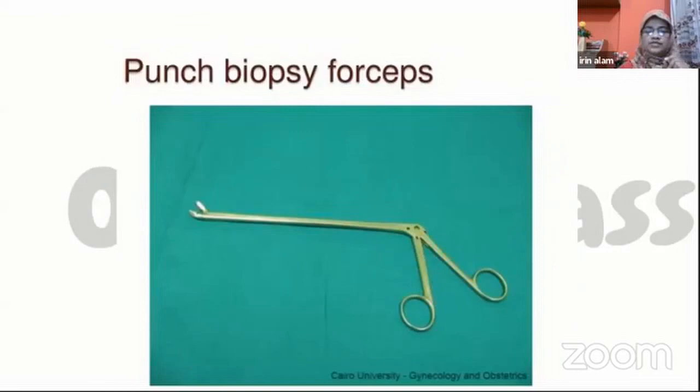So these are the instruments usually used in obstetrics and gynae. I think this class will help you. There may be other instruments which are not included in this lecture. You have to go through your book again and again and read yourself. We try to show you some of the instruments because you are not going to work in this period of time.